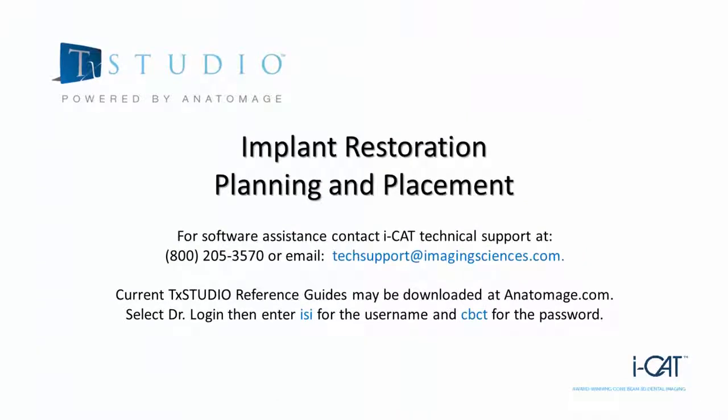In this video, you will learn how to use Treatment Studio's Restoration View tab. Restoration planning has always been simple, fast, and precise with Treatment Studio, and version 5.3 brings even more robust tools to the process. The software allows clinicians to combine their 3D images with intraoral scans for a more complete representation of the anatomy and greater predictability and accuracy of implant placement and restoration design.